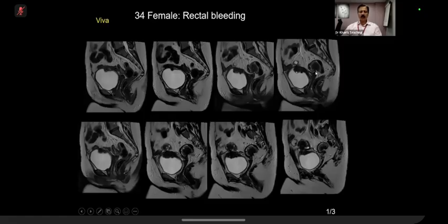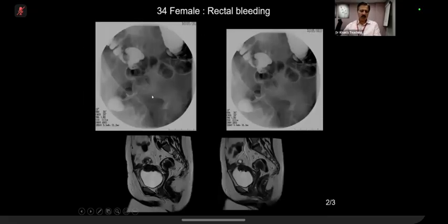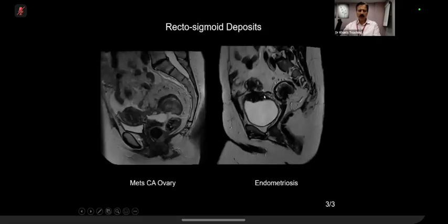When we do gynae MRIs, endometriosis, endometriomas, all of these are exam cases. And there is a hysterectomy. So the patient might have had adenomyosis, and because of that, there is a hysterectomy. So it becomes a sort of a story film. Now, this case, if you look carefully on a barium examination, again, there was a bit of indentation.